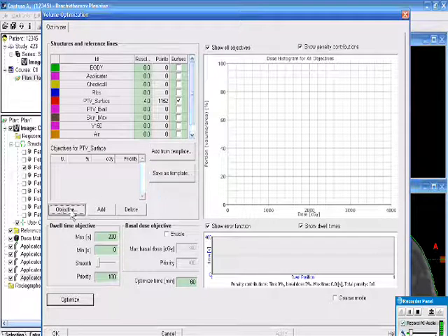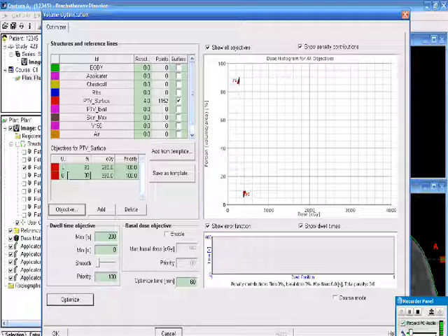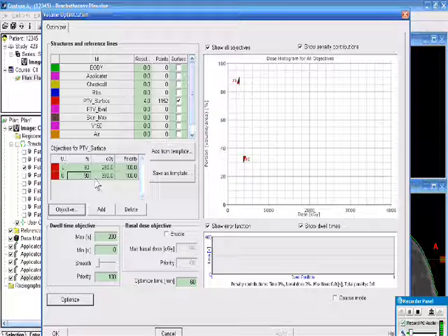So we will create some objectives for this, and I just allow it to create them however they're going to be and then change these values later on. So these are points that are along the DVH, and you can see them here. These are the default ones that just come up. I'm going to set those to be 90% of the volume. And the upper one, we can set that a little bit higher, maybe 30% of the volume. Exactly where this is doesn't matter too much.